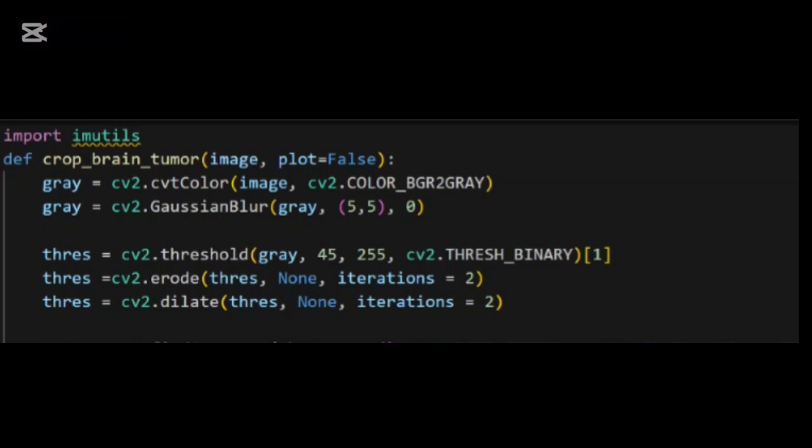Next, we are using again an OpenCV library function, which is dilate, and dilate is applied next. It expands the white region and strengthens the shape of the detected objects. We are passing our threshold image, the None, which is basically the kernel size, 3x3 width and height, and iterations are 2 for a stronger effect of dilation on our object.